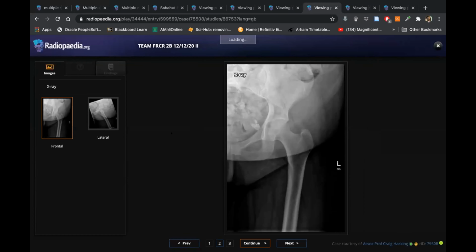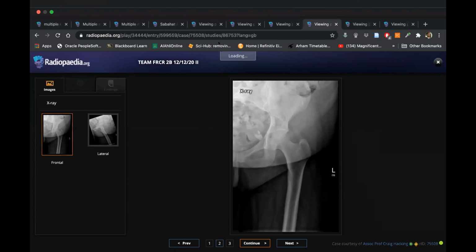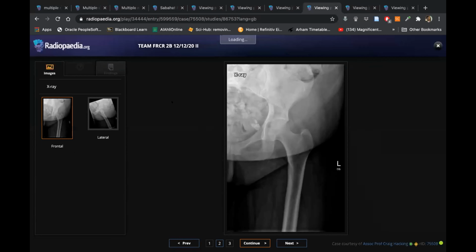Describe the calcification for me. What is the shape of the calcification? The calcification has a tooth-like appearance. Excellent. It is projecting within the pelvic cavity. Considering the shape of the calcification, I will assess the patient with ultrasound for the most likely diagnosis, a dermoid.